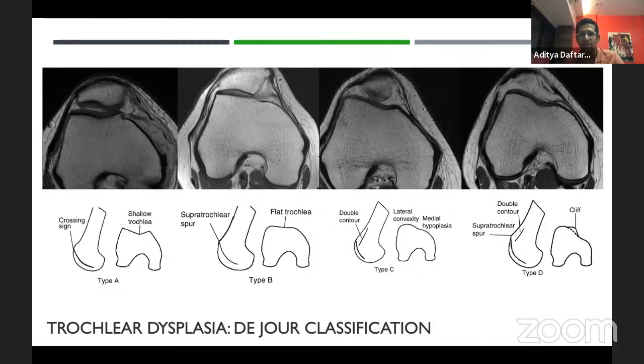We can also give you measurements here for the trochlear sulcus angle, the lateral patellar inclination angle, and a bunch of things. Just remember that the position of the patella in relation to the trochlea can change when we put somebody into an MRI scanner, because we put padding around the knee to keep it stable. If you have a very lax patella, it can move from one position to the other. So we don't normally talk too much about patellar position in relation to the trochlea on an MRI scan, because it's not as reliable.